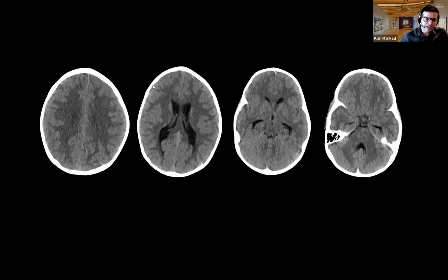The hyperdense curvilinear structure outside is the skull on the axial imaging. You do see the cerebrospinal fluid, which is dark, and it should be a nice dark density. This is within the lateral ventricles at this level. Out here, you see the temporal horns coming up, a bit of the basal cisterns, and the fourth ventricle on that particular slice.